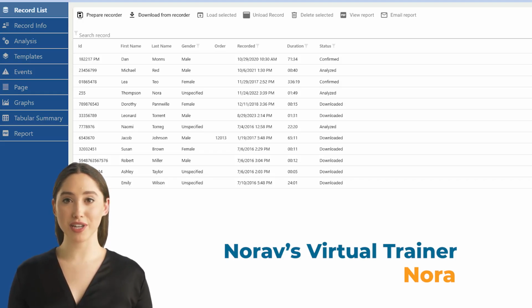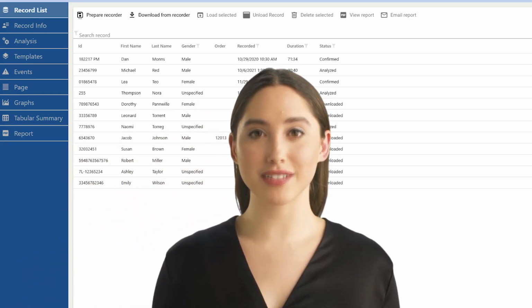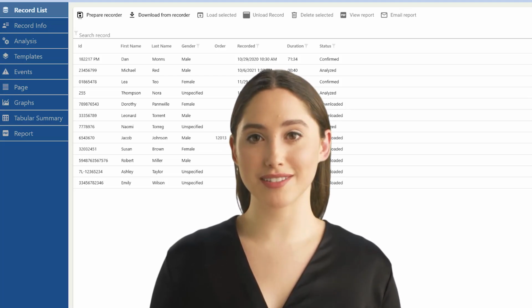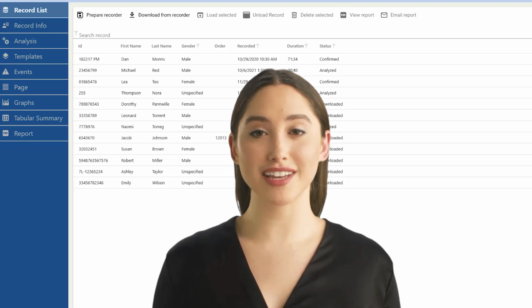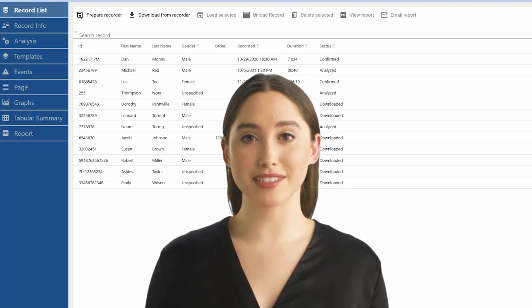In this final tutorial of our NH301 series, we are going to explore the advanced features for scanning and analysis. If you haven't seen our previous videos, make sure to check them out for an overall understanding of this advanced Holter analysis software. To perform scanning and analysis using NH301, you will go through the following steps.